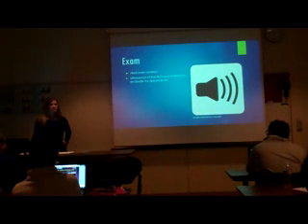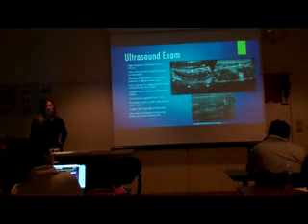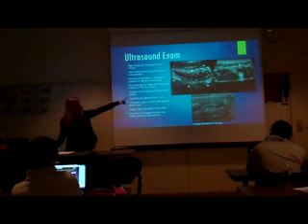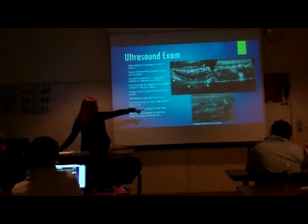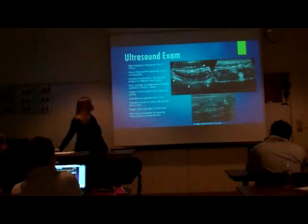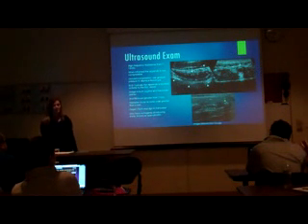A right lower quadrant ultrasound was ordered to evaluate for appendicitis. Before we get into the images, these are just some images I pulled from Google. This shows the sagittal view here and the transverse. And this is a little stone called an appendicolith that is often seen with acute appendicitis. I just wanted to go over how the process of this exam would look, since we don't often see them.